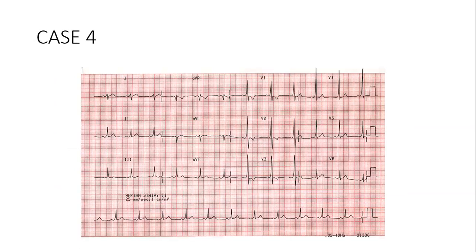One minute or 30 seconds. What's your spot-on diagnosis? You go see a 24-year-old coming in for breast reduction. She has that ECG. What is that?